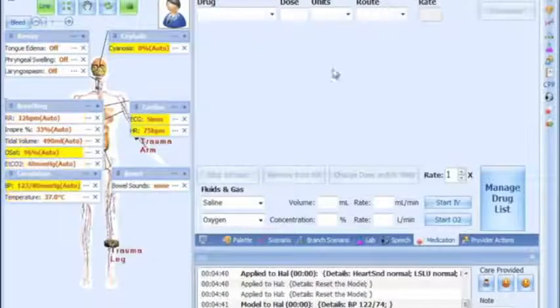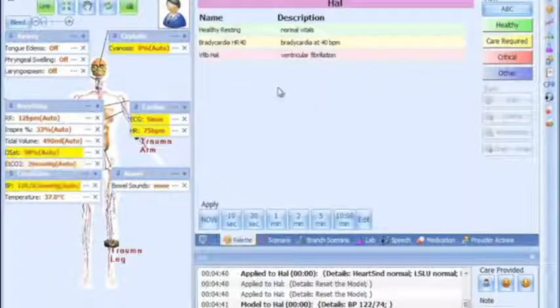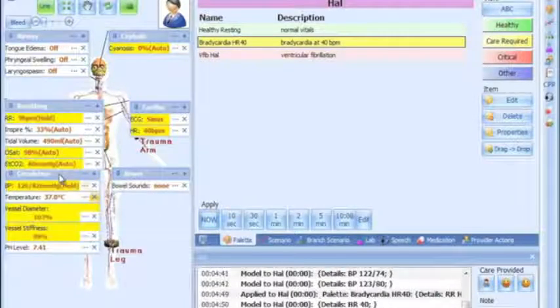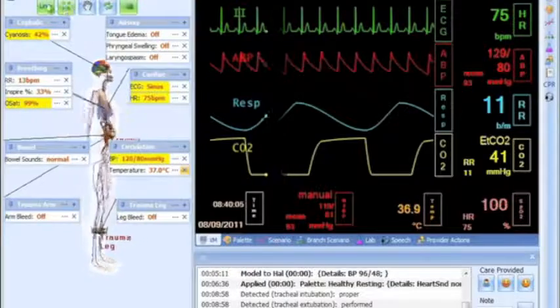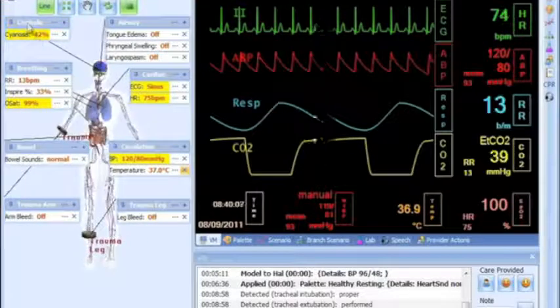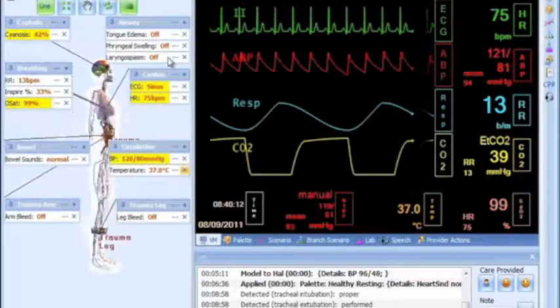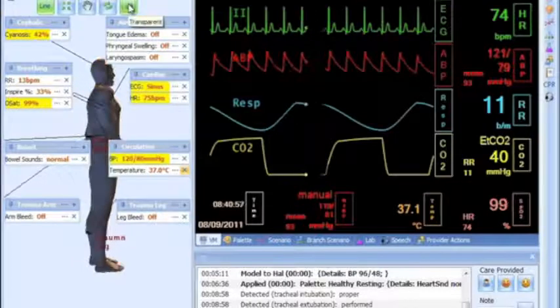Note that both modes are able to control all of the simulator features. However, the automatic mode provides more physiologic parameters for modification to allow the user to create both simple and sophisticated scenarios. The status details panel shows a 3D graphic interface of the simulator that contains the current vitals. The 3D simulator can be seen with opaque or transparent skin.